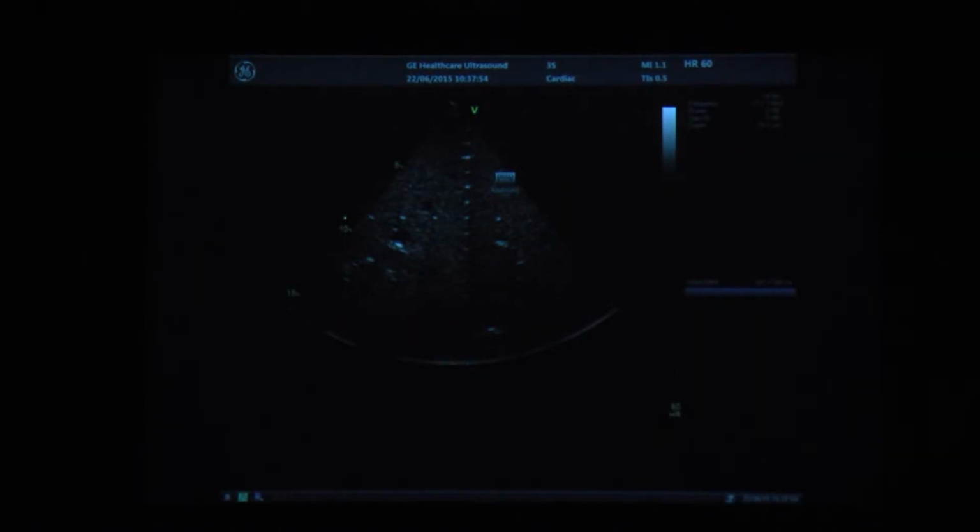Now, Robert is imaging the phantom, and move it a little bit so you can see the output rate. So I think it's the first time, at least as far as I know, that sampling is used over wireless ultrasound to demonstrate the feasibility of wireless ultrasound. And now, Robert, keep the light off yet.